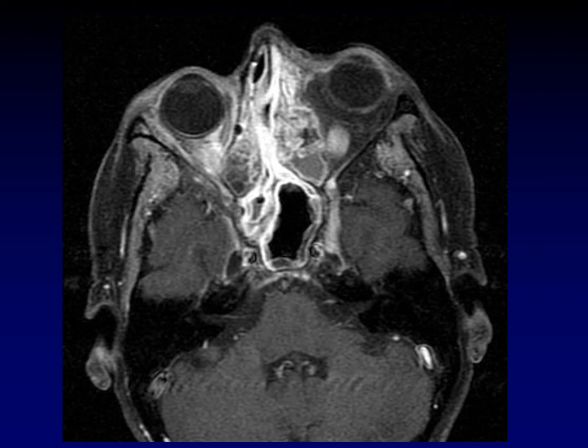Here's an example of perineural spread along the second branch of the trigeminal nerve through foramen rotundum. You can see this enhancement coming straight forward to back. Foramen rotundum is anatomically oriented straight anterior posterior, which makes it somewhat easier to identify on axial images. You can see that this tumor has spread all the way back to the Gasserian ganglion and is impinging on the front of Meckel's cave. That's the normal shape, and here impinged on the affected side.